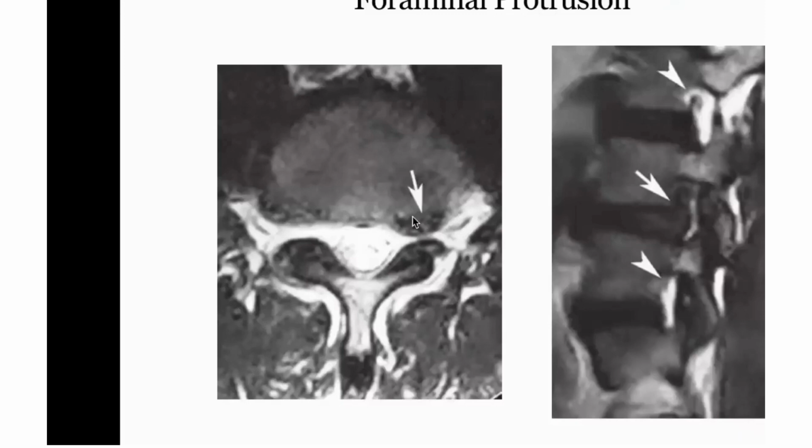You can see here, what kind of herniation is this? Foramen. That's a foraminal herniation. When we take the axial section, we can see the foraminal herniation. But what we cannot make out from here, you can see the exiting root here. Can we make out whether it is compressing the exiting root or not with this section? No, it's difficult to see that. It's not possible to see that. Both the roots look free here as per the axial sections.